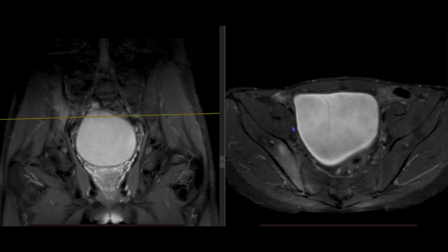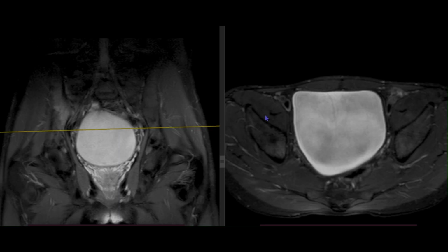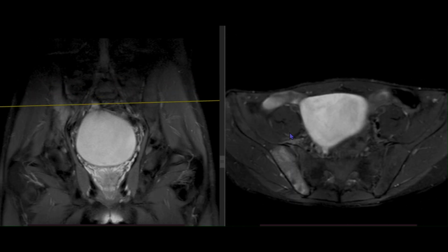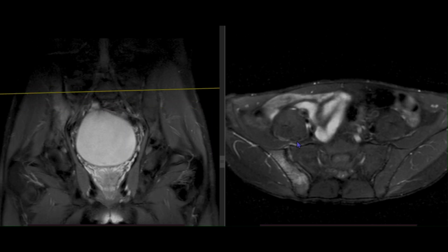So we should also see if it is tuberculous, likely it would be involving the spine, spondylodiscitis, psoas abscess. So all these things should be borne in mind while doing that. And as this patient was young, the first thing that came to our mind was an infective thing. But if a similar patient comes at around 65 years of age, we would think of a metastatic etiology or neoplasm. But the involvement of the joint makes it more likely that this is an infective etiology.